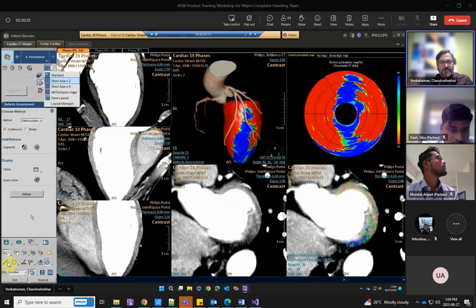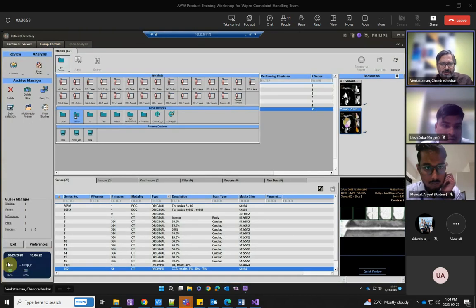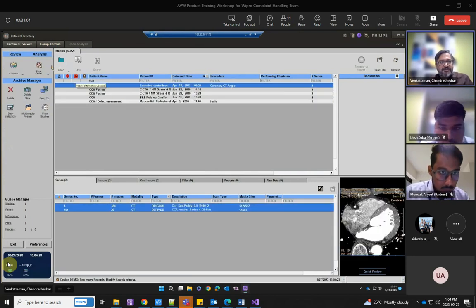There are many layouts over here. So spoke wheels if they want. So that's all about CCA. If you want to explore yourself, you can. There are some demo data already there in the demo data folder. You can actually play with them, the CCA related ones.